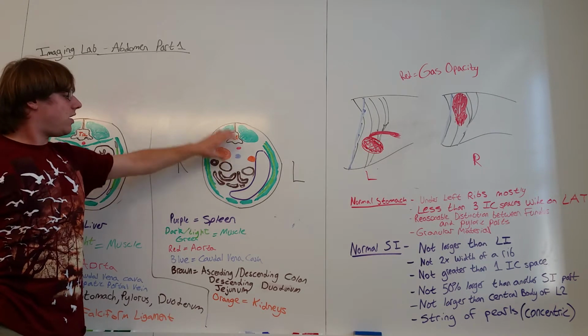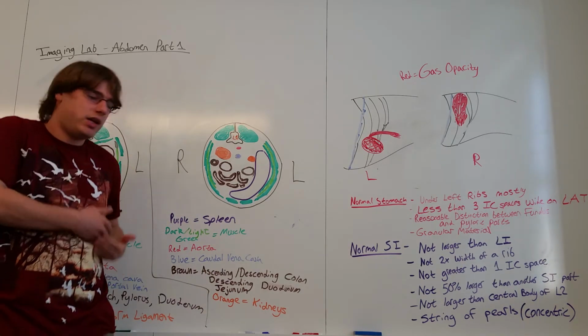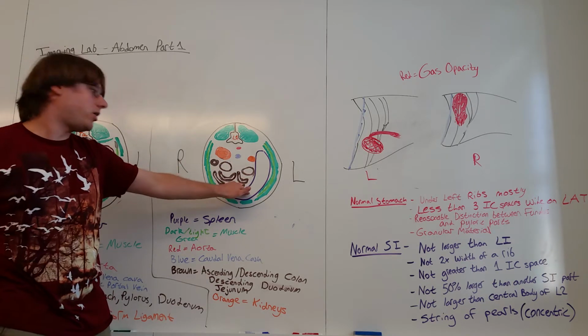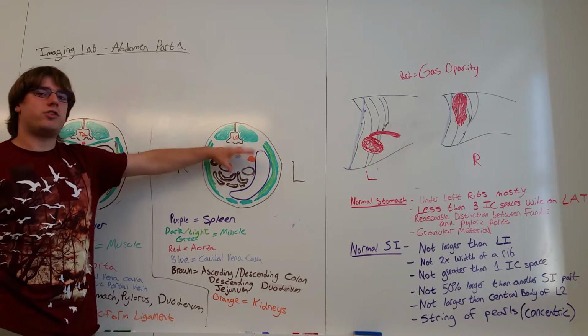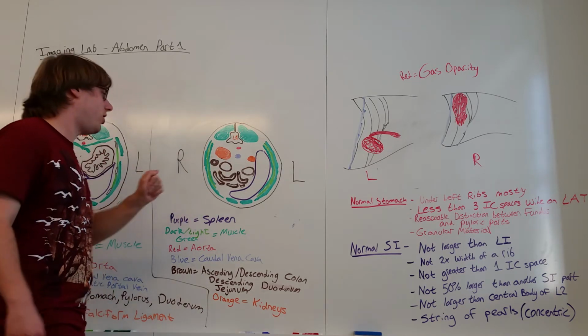And so now we have no liver anymore. This is now our spleen. We go a little more caudal. We know on the left side we have the spleen, and we'll see it kind of wrap around from lateral to medial view along the ventral aspect of the body wall. We will still see parts of the liver at this level, but I chose to omit them because they're far less noticeable than the giant spleen that makes up half our dog, it seems.